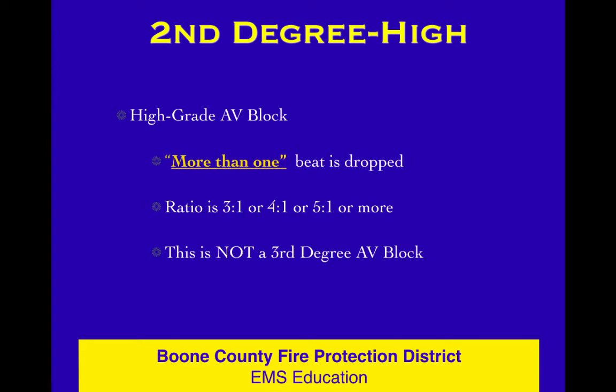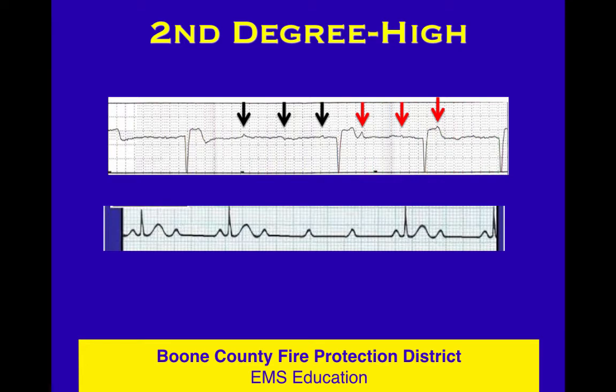So this is not a third degree AV block. Those are not synonymous terms. There's some folks out there saying that a high grade AV block is a third degree or second degree type 2. No, no, no, no. High grade AV block is its own specific rhythm. And here's an example.